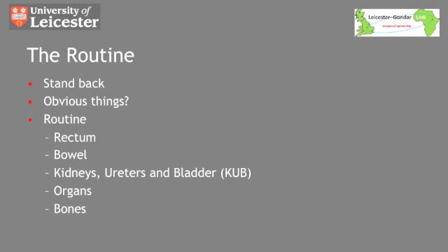As with everything in medicine, it's important to have a routine and stick to this, as it will help to ensure you do not miss any findings. Once you've confirmed the x-rays are of the correct patient, you should stand back and take in the whole x-ray and notice any obvious findings. I would suggest then that you go through your routine.